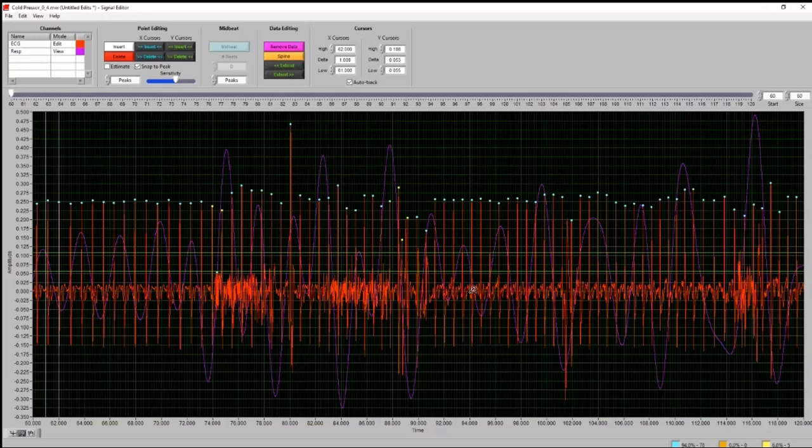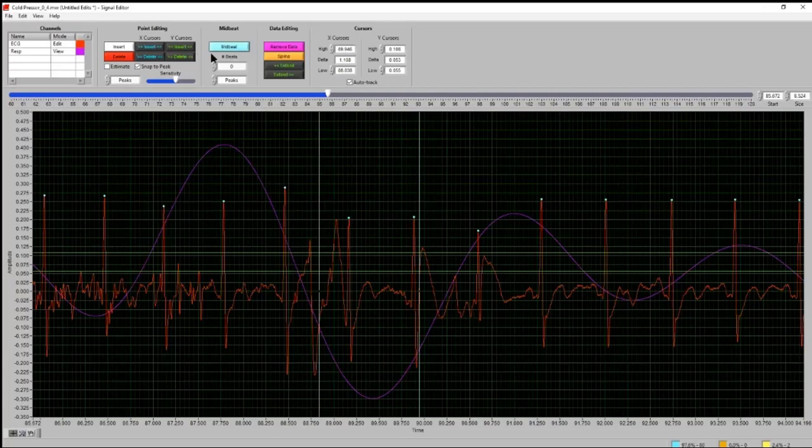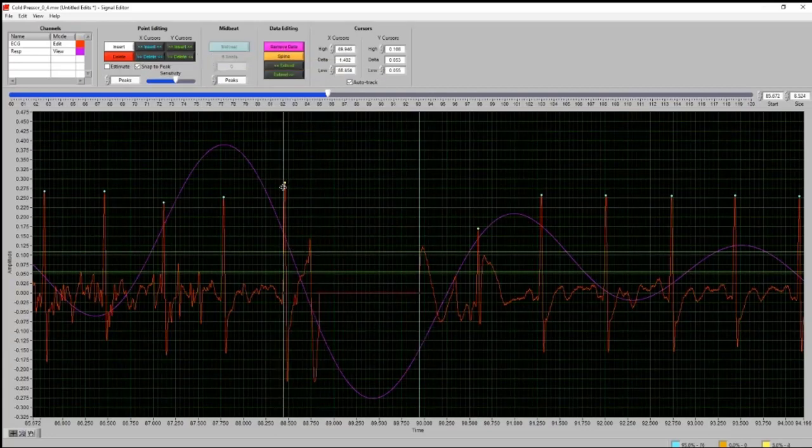Okay, so let's go ahead. This one before, as I said, was pretty clean after we actually looked at it, but I'll go ahead and remove some data, just as if the electrode came off or there was an actual missed beat that didn't occur in that participant. So you can imagine this as noise or electrode fell off, again, anything. But just to exemplify the midbeat procedure.